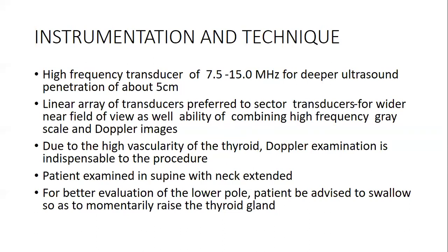The linear array transducer is preferred to a sector array for a wider near field of view, as well as because of the ability of combining high frequency grayscale and Doppler images, producing high resolution.